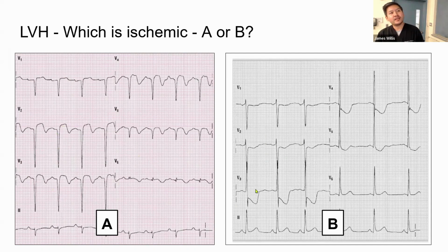Yeah, so also kind of out of proportional depression, discordant depression. If you were to calculate it, it'd probably be greater than 15%. But just looking at this, very deep. These R waves are similar, but this one is significantly deeper than V5. Yeah, exactly. Good call. So I don't even have to look at this. This is concordant depressions, very concerning for MI.